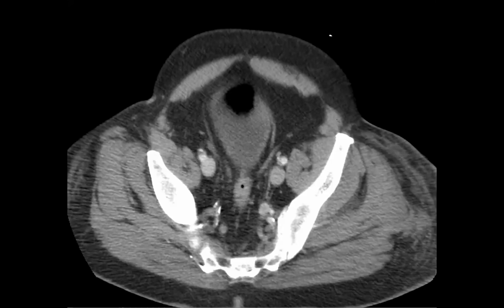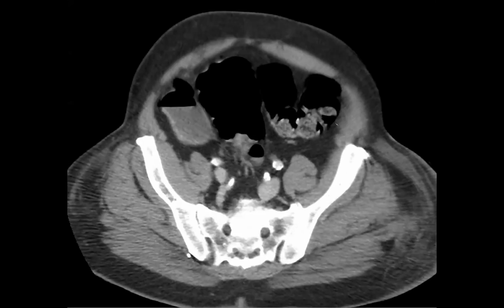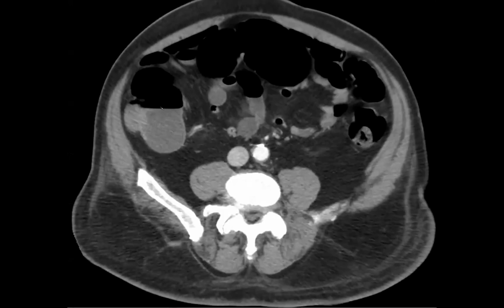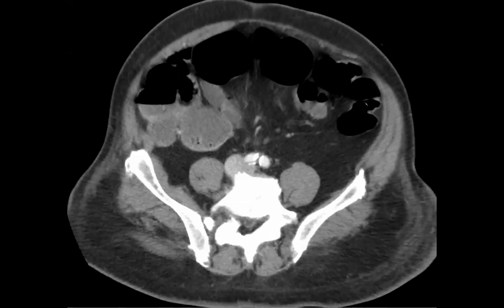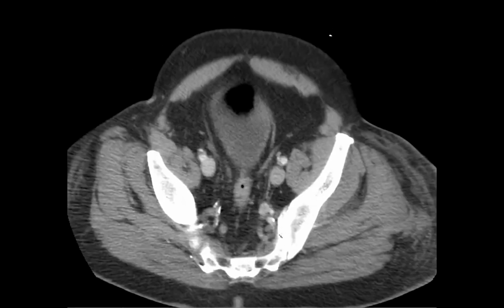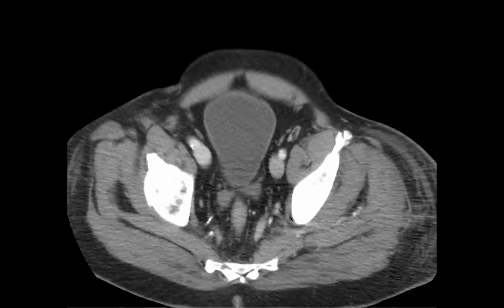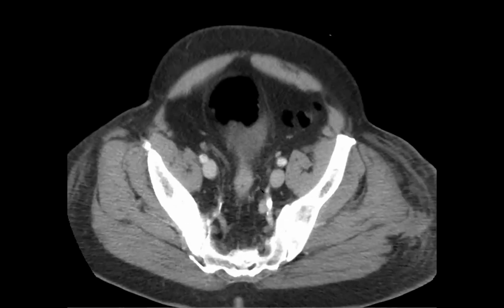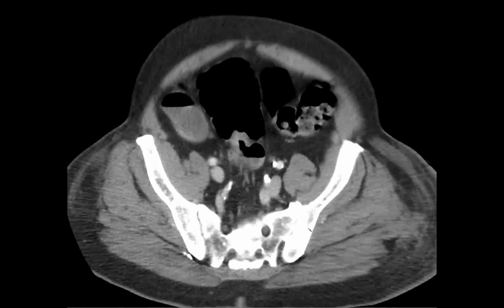Okay, these are pretty quick. This patient was post-op from a surgery, and they had this dilated colon. There were air fluid levels, a distended colon, and then kind of a transition right here. Do you guys think, what do you guys think about that? Are you concerned about this transition here?